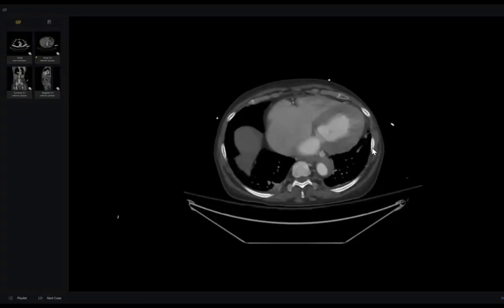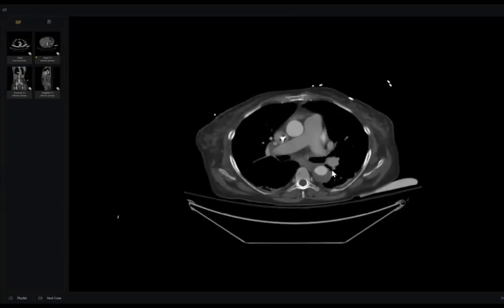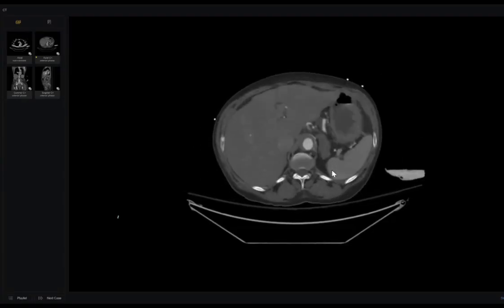The patient has acute, very severe chest pain, acute aortic syndrome, and we find some hyperdensity in the pre-contrast, suspected to be either a hematoma or atherosclerosis. Changing position looks like dissection, so it is an intramural hematoma.